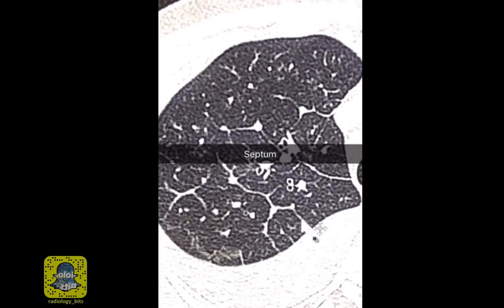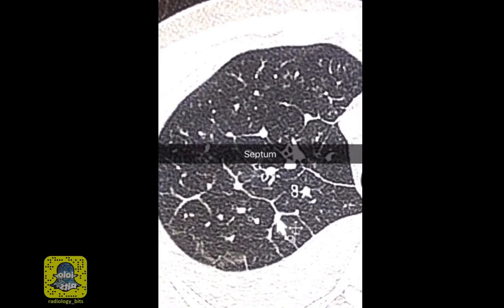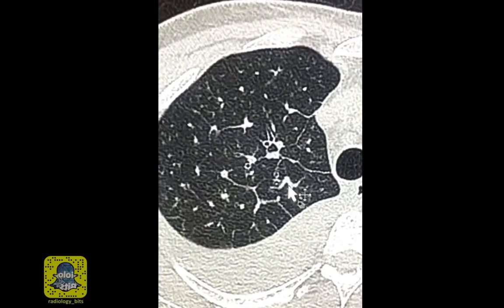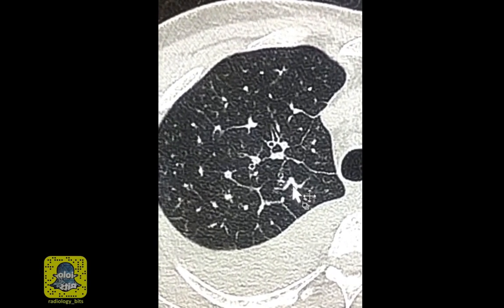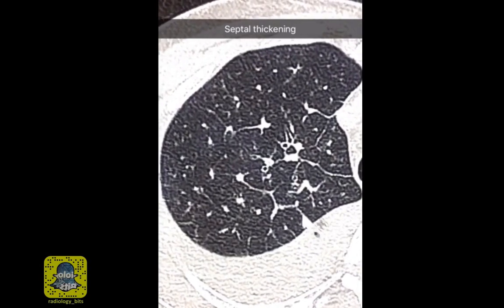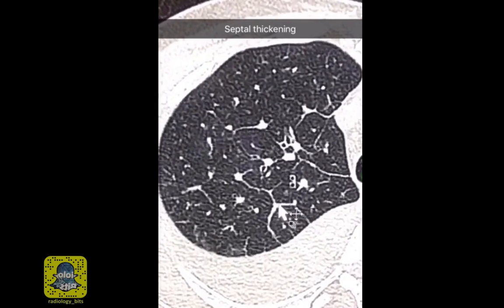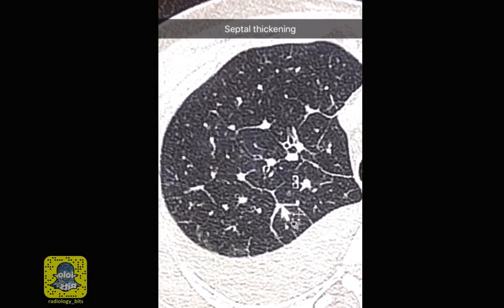This line of the interstitium here is called a septum. So all of these are septae. Only a few scattered and incomplete thin septations may be seen in a normal lung. When you see multiple septations that are thicker than usual, this is called interlobular septal thickening.